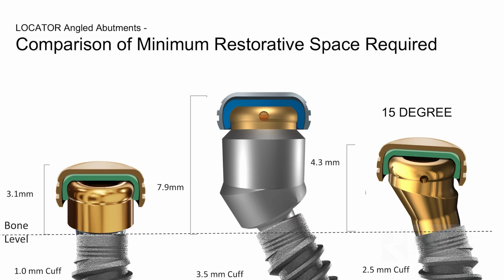So they made a solution so that you could have a case that already had SRA abutments and maybe deep implants, and you would be able to put this abutment on to straighten out that implant and turn it into a locator fixed. That was invented before the most recent product, which is angled locator fixed. So now we have an angled locator of 15 degrees where we can get rid of the SRA and go directly to the implant in order to parallel those implants better.